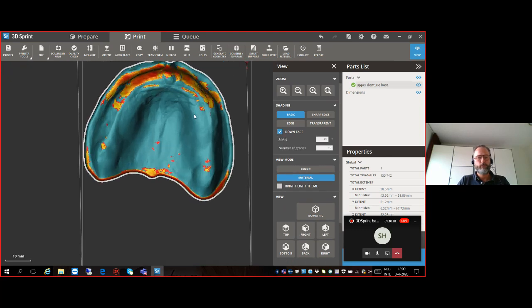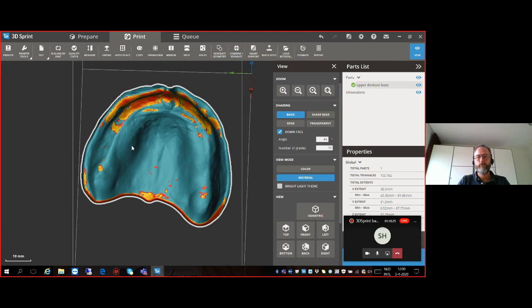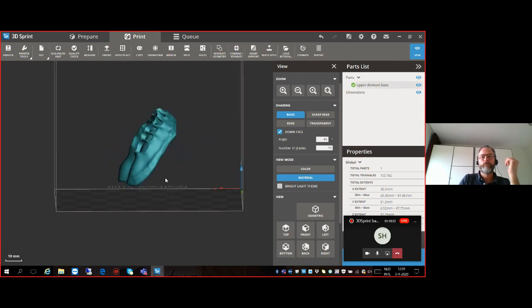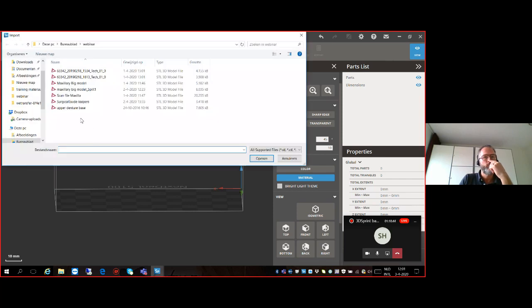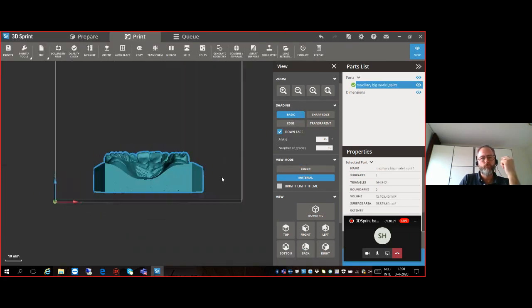Awesome. Very good. And the very last question that I just got in, do we have any tips on printing vertical models? Not sure, this could go two directions. We can quickly show just an orthodontic model placed vertically, so you can fit a lot of models in the build platform. But of course, we also have stacked printing that we released at the Chicago Midwinter Show in February, which will roll in automatically into the 3D Sprint update, probably end of this month.